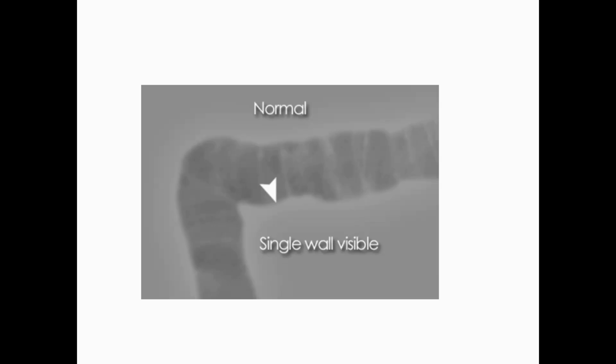We can do an abdominal AP projection to detect signs of perforation for a critically ill patient who is unable to stand erect. So we do an abdominal AP projection instead of an erect chest X-ray. Let us see the signs of bowel perforation with the patient in AP projection.